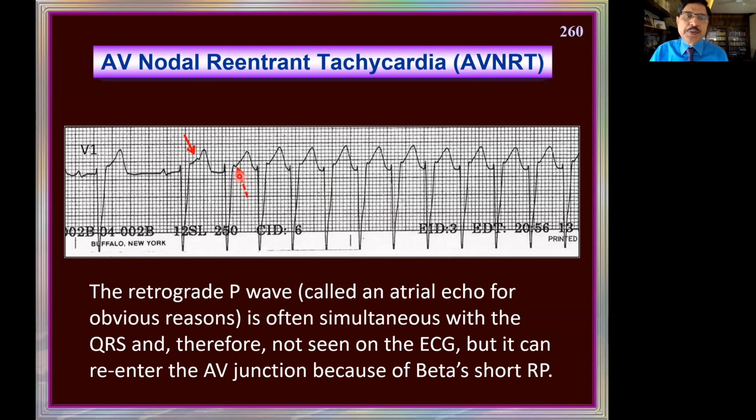You see the P wave is impinging back and coming here. Sometimes it goes there, sometimes it is here. You can see the notch because of the retrograde conduction. Regularly it is coming there. So there is antegrade flow into the ventricle and retrograde flow into the atria. At the beginning of the T wave, you can see the P wave there, notching of the P wave.